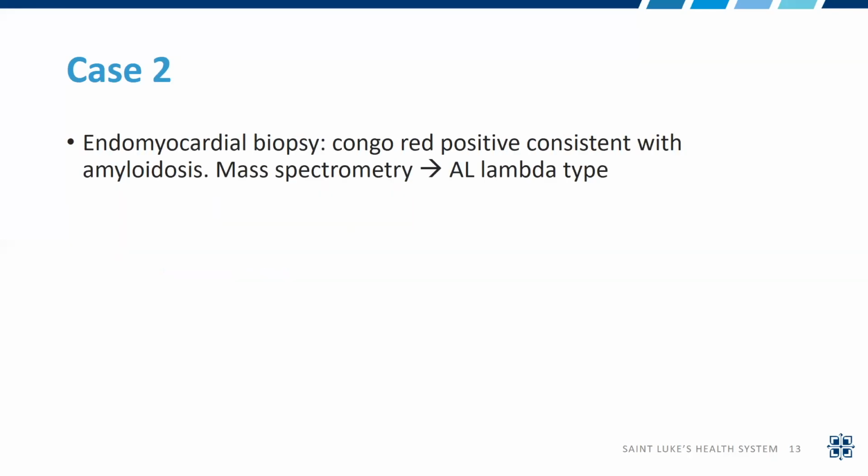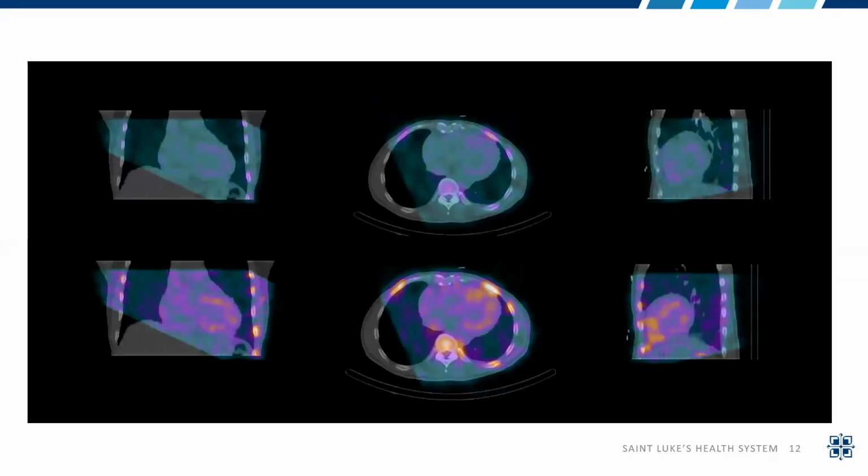Eric, I know we've talked about this case a lot. Do you want to make some comments from a technologist standpoint as far as this first set of images you're getting, and then scaling them up or down, and just how the myocardium interacts with the blood pool? This is a 1 hour study, just to make everyone aware.